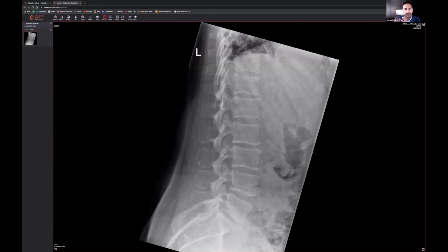Right, so this patient, a little bit more subtle. If you can see the abnormality, please throw it out there, because occasionally you do get someone who's a bit of a whiz and they throw it and you think, wow, that's pretty cool. So if someone can see it, go for it. Just be brave, put it in the chat, and yeah, it'd be really nice if you could do that.